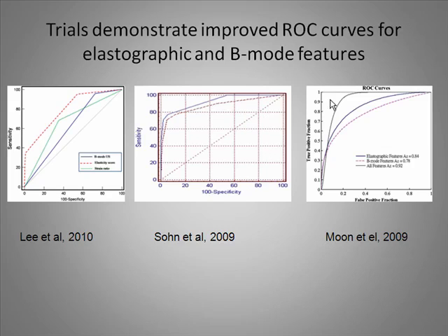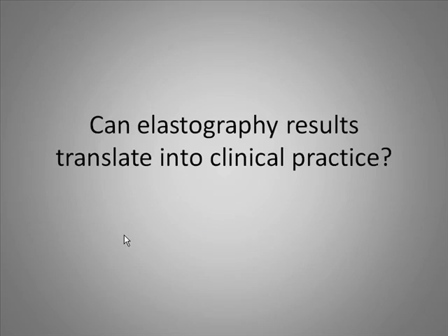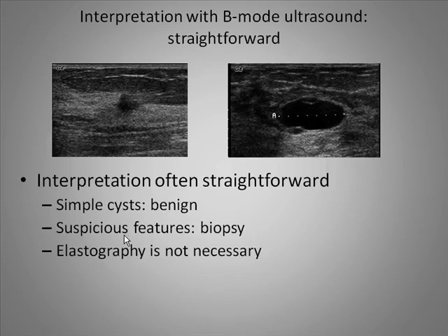Again, researchers have shown improved ROC curves when they add elastographic assessment to B-mode features, but how that translates into clinical day-to-day breast imaging is not as clear. So using these results in clinical practice, remember that many times interpretation with B-mode ultrasound is completely straightforward and there is no need to use elastography at all.